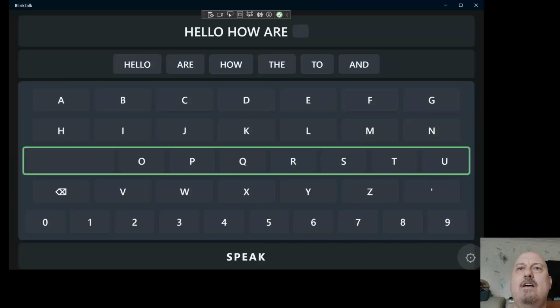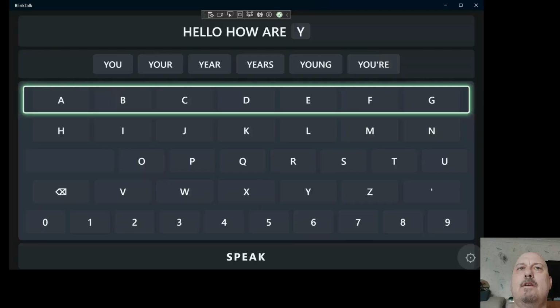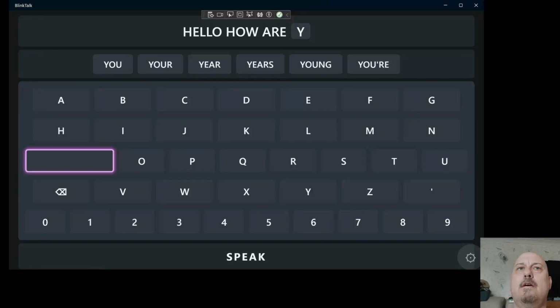How are, and then I want Y, then O, then U. Y. O.